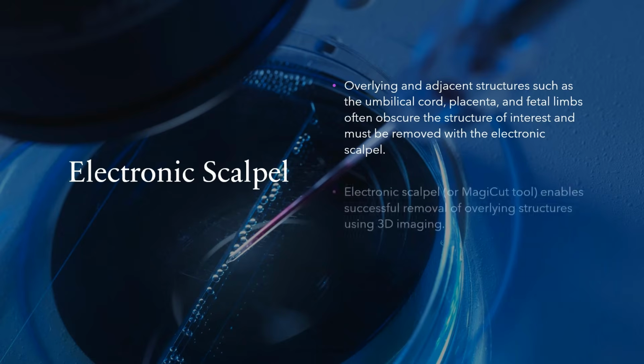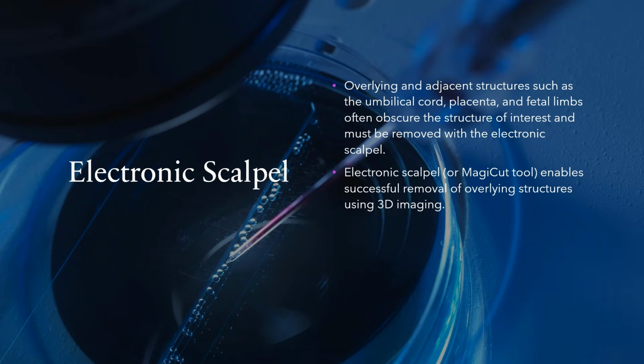The electronic scalpel or MagiCut tool addresses this issue by allowing clinicians to remove overlying structures using 3D imaging technology. It enables the user to isolate the target anatomy with precision, making it easier to assess structures without interference from surrounding tissues.